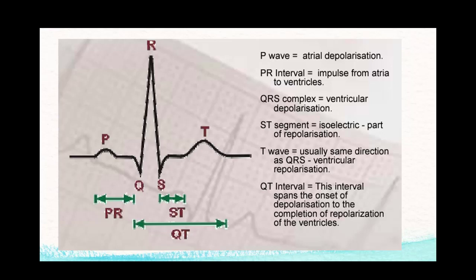So that's how they can tell if the leads are appropriate. And that's why it's easiest for you to look at lead 2 for any kind of EKG interpretation until you get your EKG legs under you. Once you figure out what you're doing with it, then you can start looking at what's going on in other leads.